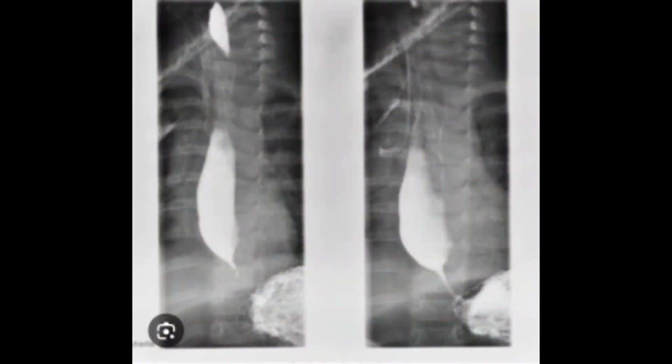A beautiful example of achalasia cardia. It is called achalasia cardia because it is just near the cardiac surface, so that's why it is termed achalasia cardia. The particular sign of this achalasia is the rat tail appearance, also called the bird beak appearance. You can appreciate a very tiny stricture at the distal end of the esophagus, and it also causes pre-stenotic dilatation. So this is a clear example of achalasia.